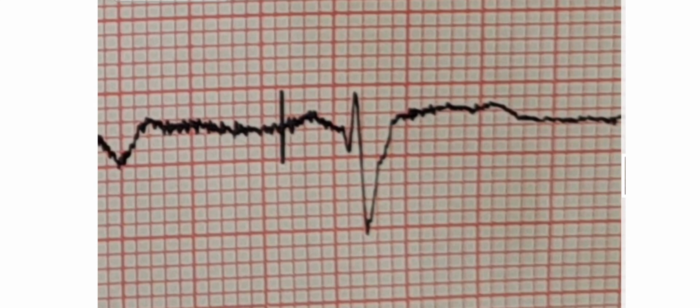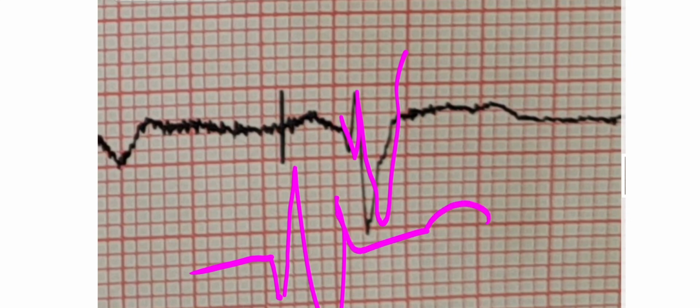We've got our beautiful W here, guys. You can see that's a W. From the isoelectric line, there's a small downward deflection, and then it goes up again. Then it does that, then it comes back to the isoelectric line.